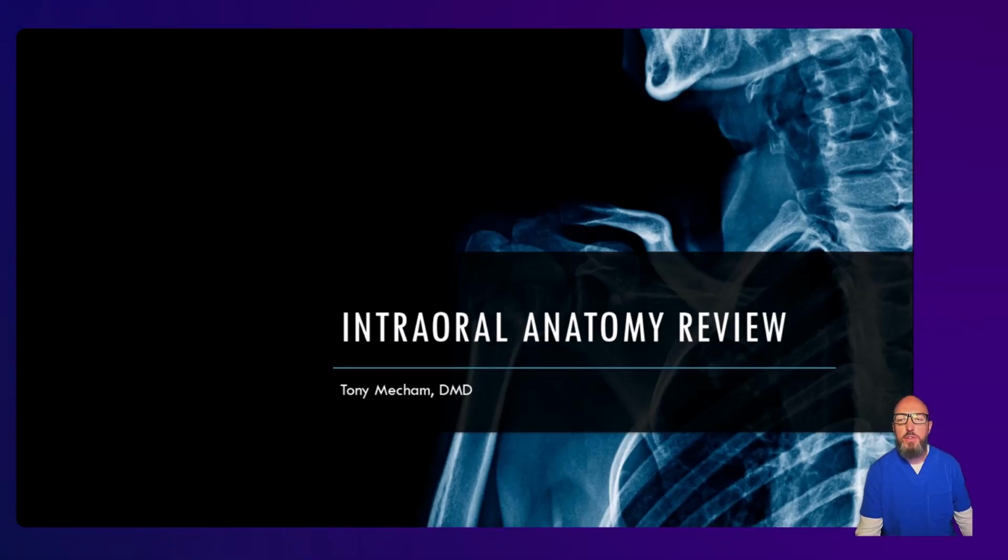This is part 2 of the anatomy review where we're going to go through the actual structures you should be able to identify on a radiograph, specifically the intraoral radiographs. We'll start with the maxilla, then we'll move to the mandible.